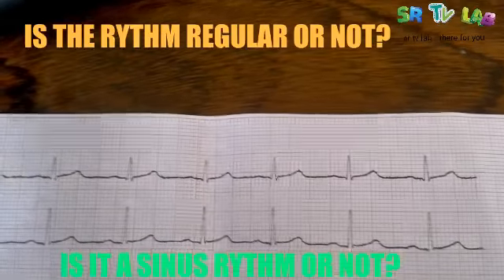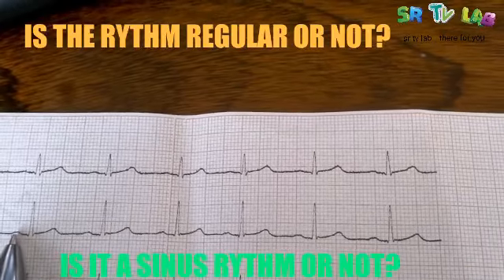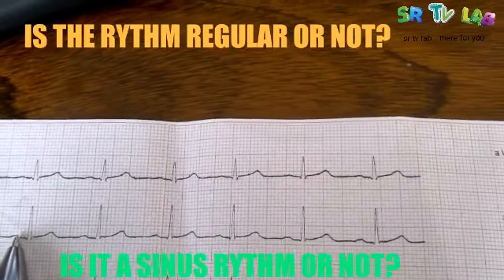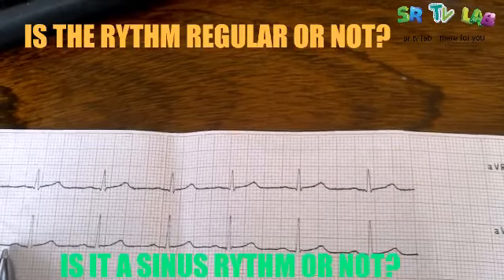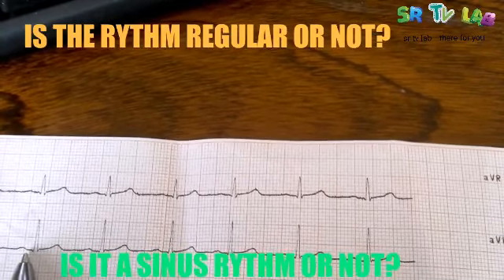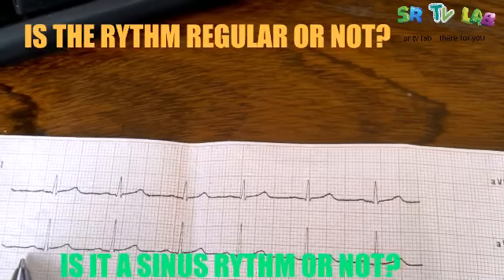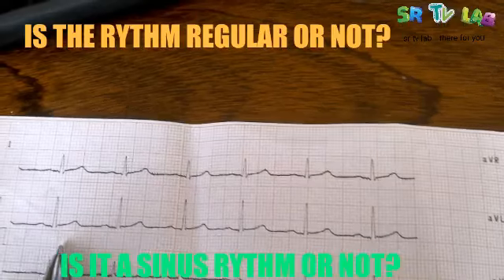You count from the beginning of the P wave to the beginning of the R wave, and you calculate the interval. Then I will tell you the normal distance for this interval, and we'll see if it is longer or shorter and come out with a conclusion.